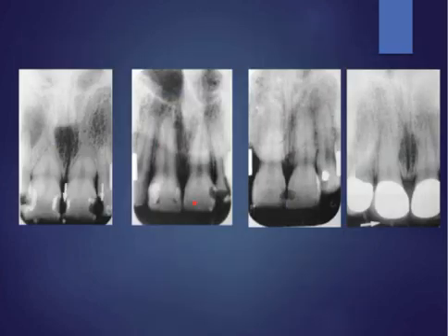Now, how to differentiate between restorations and caries. This is a porcelain fused to metal crown. This is the metal portion of the crown, and this is the porcelain region which appears radiolucent. When you see the borders of the radiolucency as very well defined, it means that a cavity has been prepared and it has been restored, so it is a composite or a silicate restoration. But when you see an irregular area of radiolucency, you should always suspect it as caries.